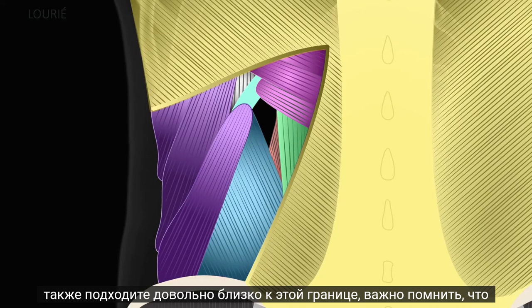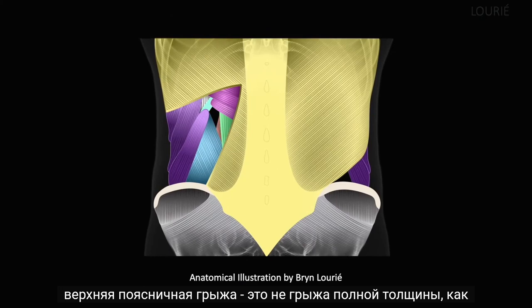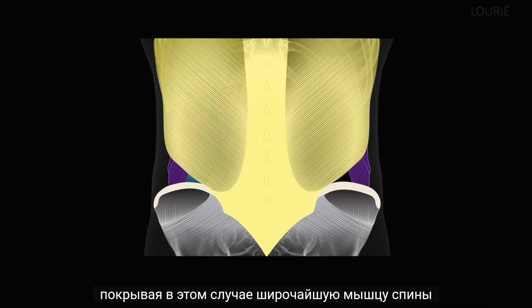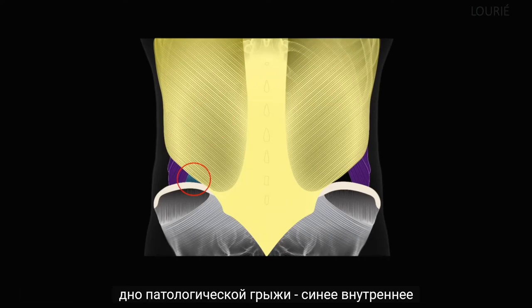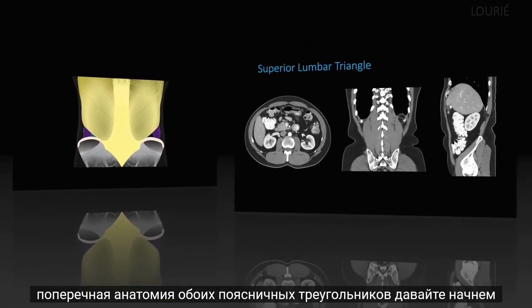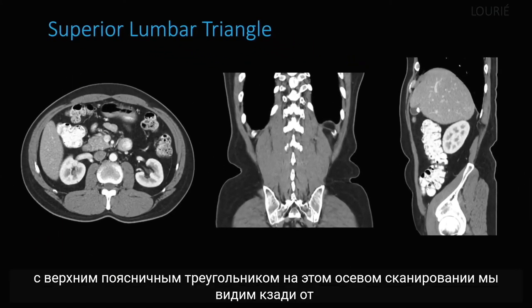It's important to remember that the superior lumbar hernia is not a full thickness hernia. Like a Spigelian hernia anteriorly, it has a roof or covering, in this case the latissimus dorsi, over it. Here you can see Petit's hernia, and on the patient's left side, you see the floor of Petit's hernia is the blue internal oblique. To fully recognize the pathology of lumbar hernias on a CAT scan, we must first recognize normal cross-sectional anatomy of both lumbar triangles. Let's start with the superior lumbar triangle.